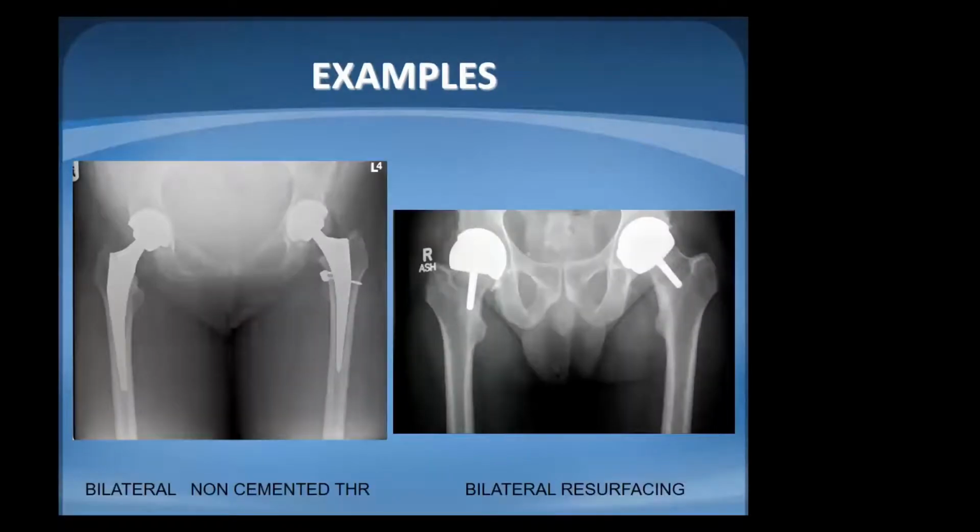Once you have placed an implant, there are a few things that the AP view tells you, and it tells you quite a lot. You should make the most you can of this, because the use of CT, MR and ultrasound is riddled with challenges from artifacts, from positioning, and from lots of other factors that impede your reading.